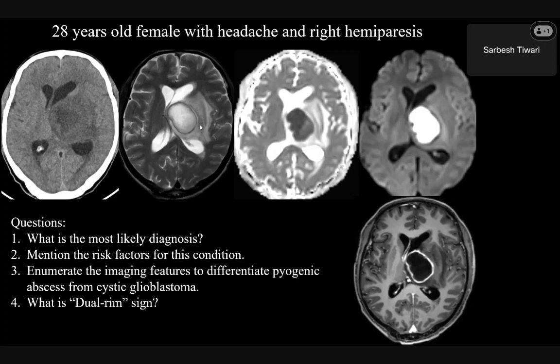Okay. T2 hypointensity, membrane-like, in the outer layer and the inner layer, Kamlesh. Where do you see the T2 hypointensity? Necrosis plus edema, inner layer of T2 hypointensity. All right.